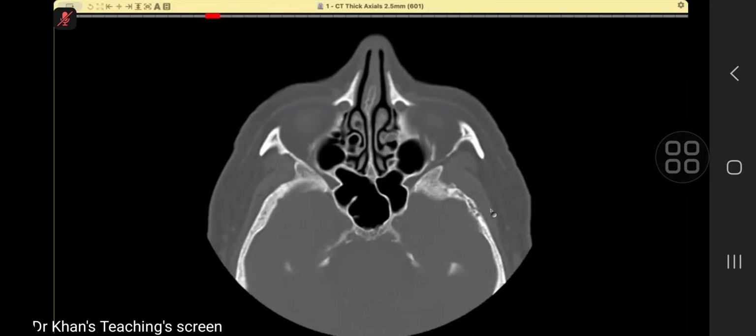And now the new classification is that instead of hemangioma, we call it vascular malformations, and there is more to it. But if you call it hemangioma, fine, confirm it with a CT scan. So they will come in the MSK world. I am showing you a base of skull case, but part of it was the anatomy and the concepts of what it does. Okay, thank you, candidate 3.